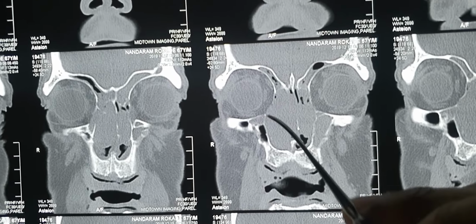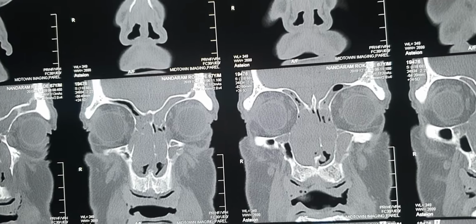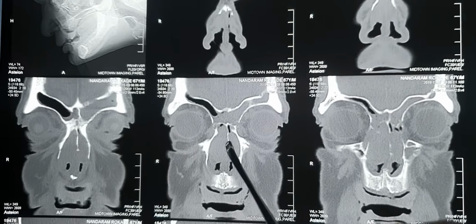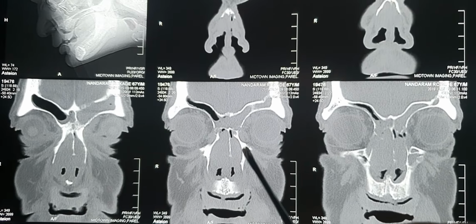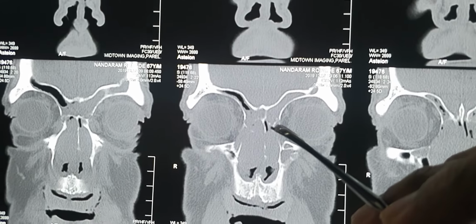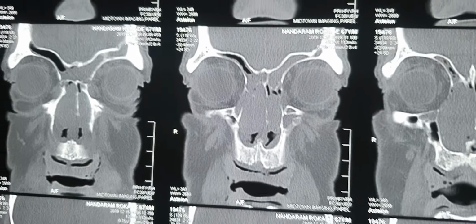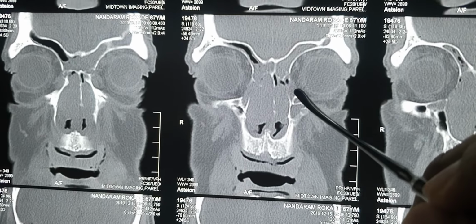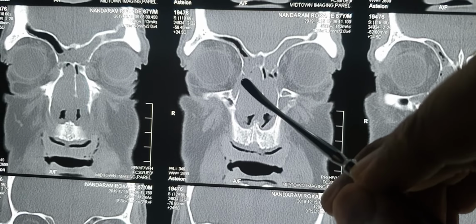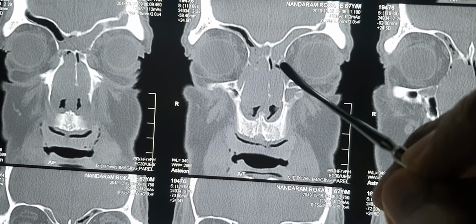Now, the second thing in identifying after the area of the nasolacrimal duct system is the agger nasi. Normally, if you keep on following the frontal process of the maxilla like this, you reach the nasolacrimal duct system, and the very first pneumatization in this region, just near the region of the nasolacrimal duct system, is the agger nasi cell.